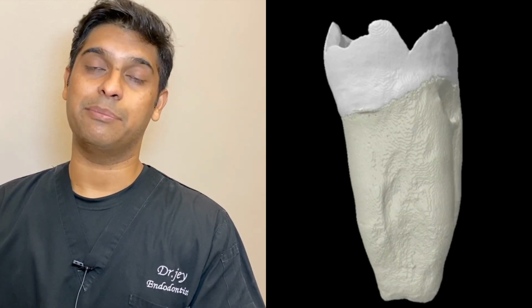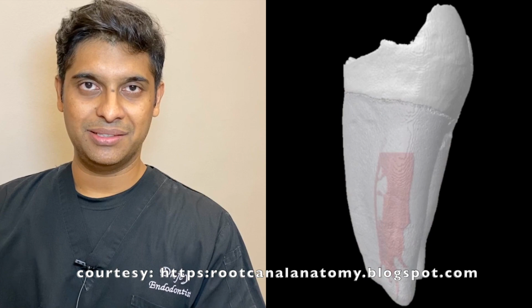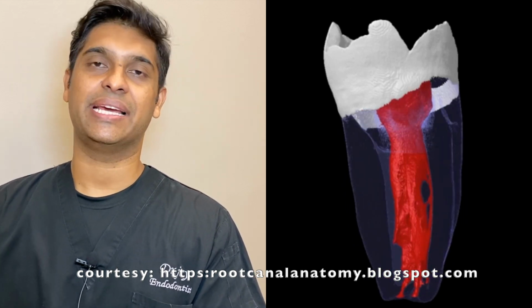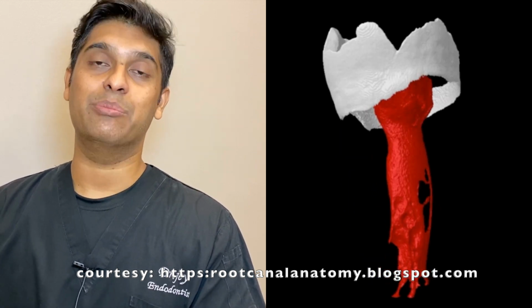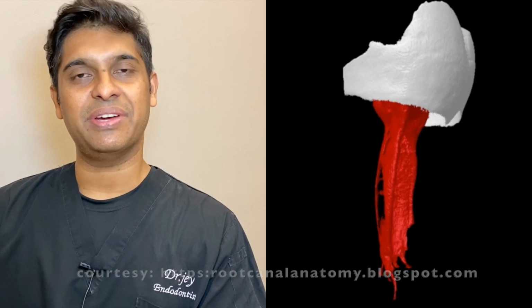So what makes it very difficult for a practitioner to manage a C-shaped canal in a mandibular second molar? It is the complex anatomy of these teeth. If you watch closely, they have 1, 2 or 3 canals just like other molars, but these canals are connected with an isthmus in most situations. This isthmus is a very thin ribbon-shaped canal or connection with pulp tissue. So the idea is to remove and clean this area which is inaccessible with your regular rotary and hand files.